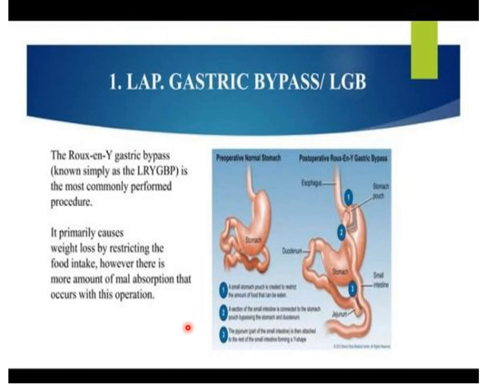Laparoscopic gastric bypass, which is also called a Roux-en-Y gastric bypass, is, as I told you, the commonest and preferable one. As you see in this picture, number one, this is a small pouch of the stomach that is separated from the large part of the stomach, which is called the excluded part. The small pouch is the restriction way of the bariatric surgery done for the patient.